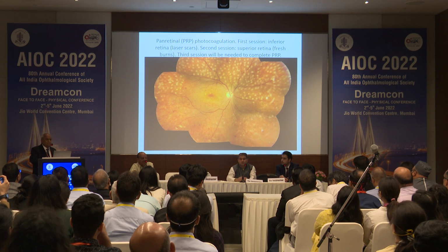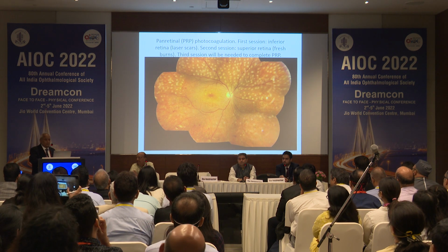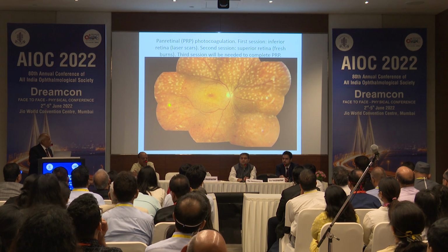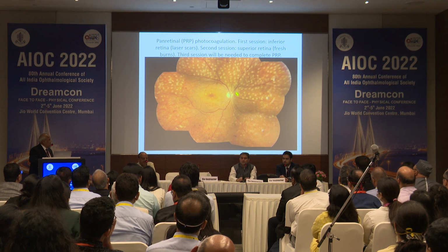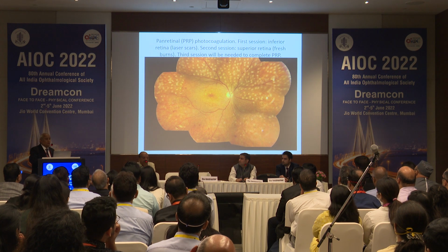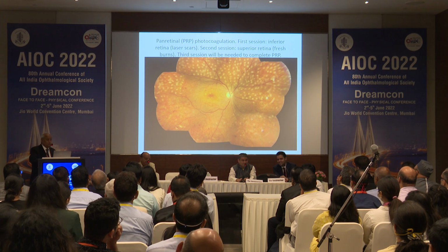You have a patient like this coming to you from your friend, and what would you look for, and how will you manage this case? So here are laser shots given, nicely and properly given. There are some changes in the macula. How will you manage this case? Third session will be needed. Would you like to do further laser? Would you do angiography? Would you do OCT?